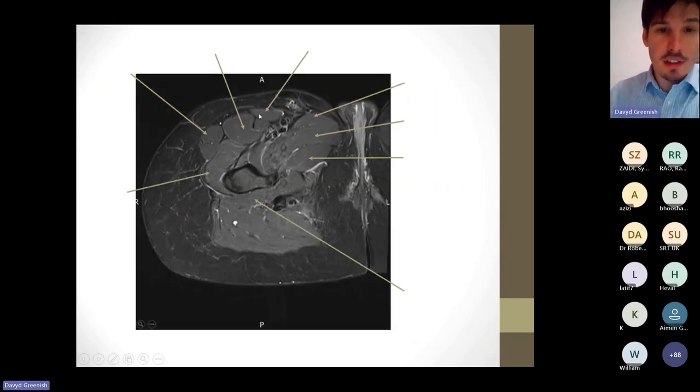Lovely. That's very good, guys. Okay, so again, most anterior muscle, we've got this black line through this muscle, and just lateral to that, we've got another muscle. So these are the same three over here. We've got the tensor fasciae lata, the rectus femoris, and the sartorius slightly lower down. How about these three muscles coming down here, though?